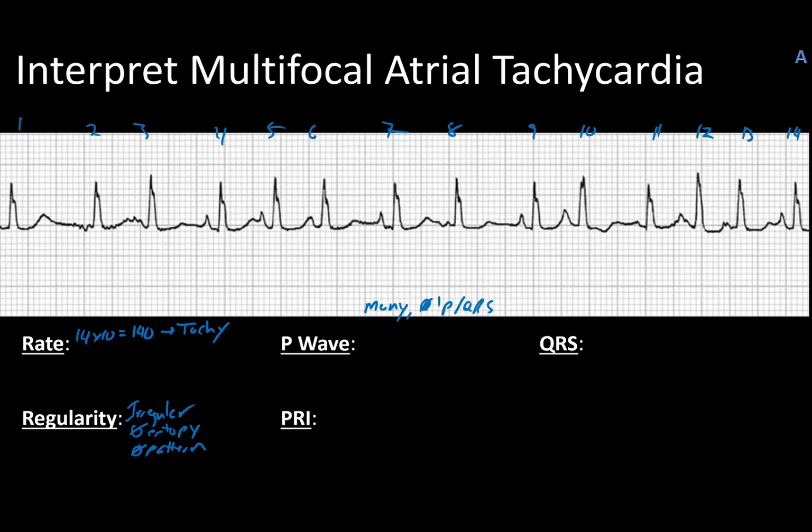So let's just go ahead and start labeling these. That's the best thing to do in situations like this. Beat number 4 has a nice sharp-looking one, so let's name that A. Beat number 5 has a sharp one. 6, it's a little hard to tell. 7 is sharp, so we'll give that an A. Number 9 has a sharp one. Hard to tell with 10, 11 definitely doesn't. Don't know about 13. 12, 14, that one has a sharp A. And that's pretty much the only ones through there.